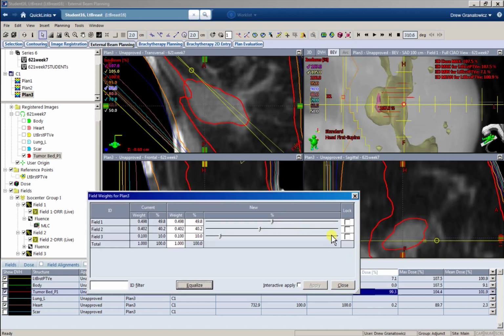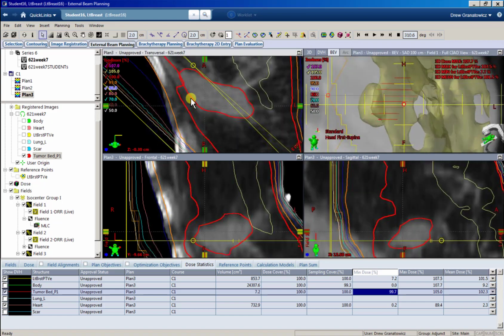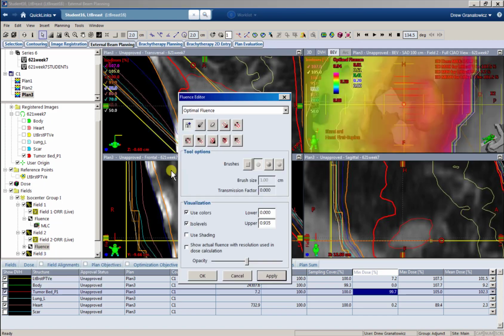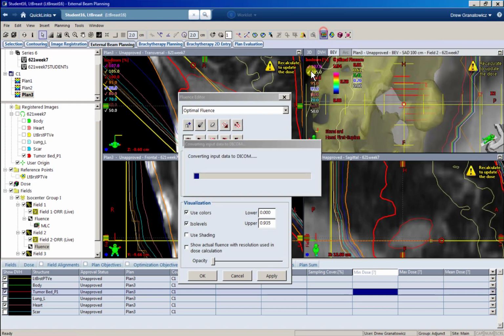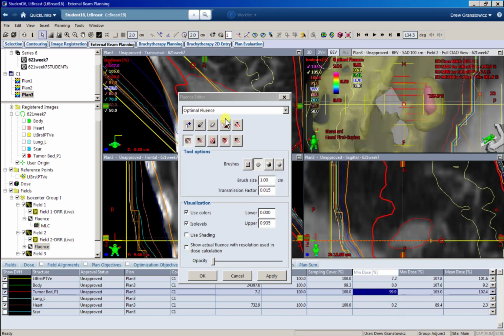Since we had enough PTV coverage, let's add some more 15s. 99.7. So close. 99.9.